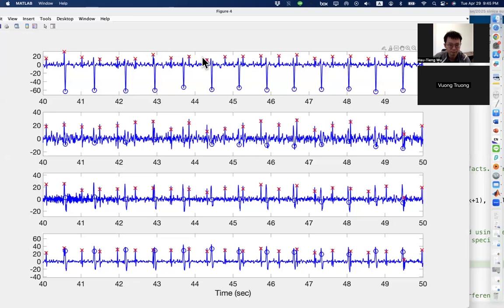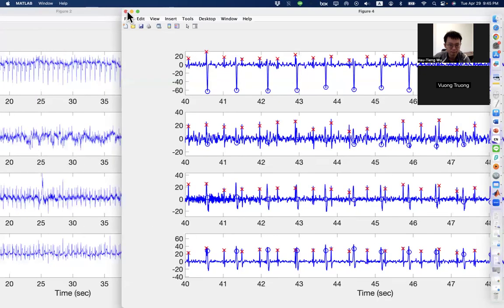If we cannot, can we estimate fetal heart rate and so on? And you will see that the Dshape algorithm will be one way to help us achieve this goal, in particular when we only have one channel, one trans-abdominal maternal ECG channel.